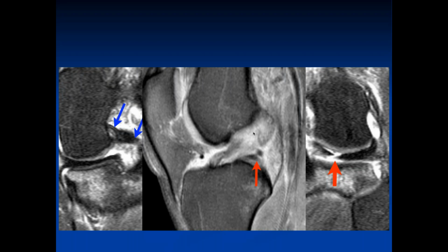So I think they had some type of pivot shift injury where they tore their ACL and also tore the posterior horn of the lateral meniscus. Right, and you can do that if you have a pivot shift mechanism, because the motion of the bones then causes tugging on Wrisberg's ligament onto the posterior horn of the lateral meniscus, and that can cause a tear.